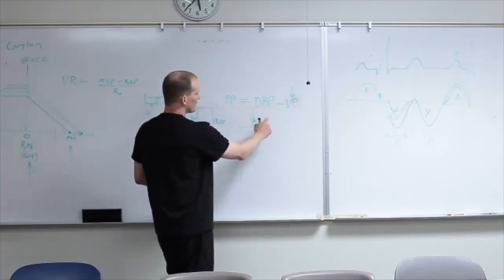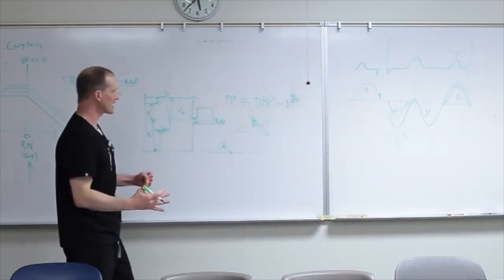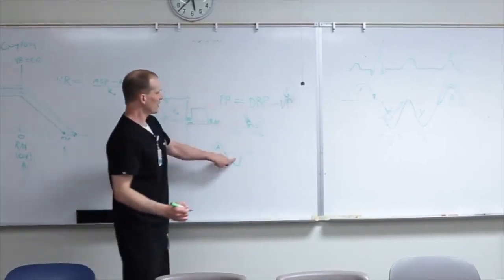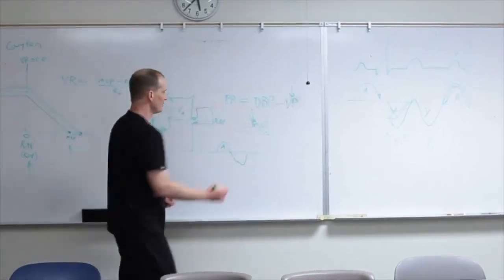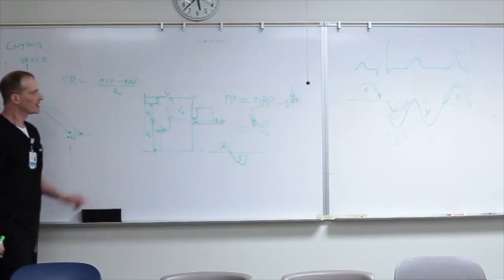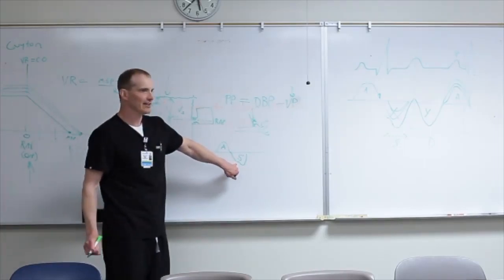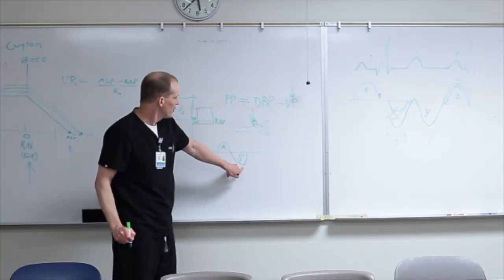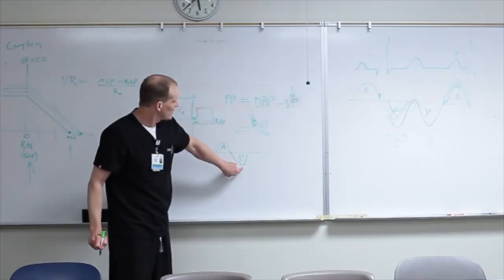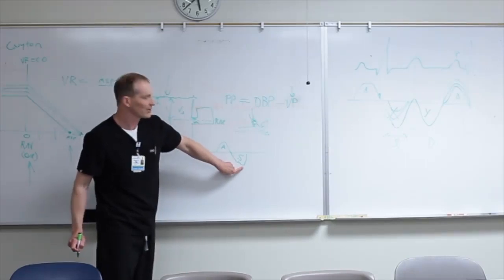And then we have the right atrial relaxation and the right ventricular contraction, and we get a wave like this that we don't call an X descent anymore. We call it, more logically, an S wave. Okay? Sometimes you will see two blips of the S wave, and the first blip is actually called S1, and the second one is S2. And what that is actually is the atrial relaxation component and the right ventricular contraction component. So atrial relaxation, ventricular contraction.